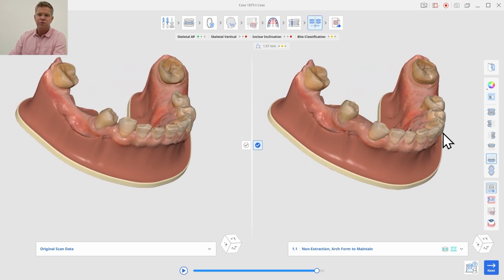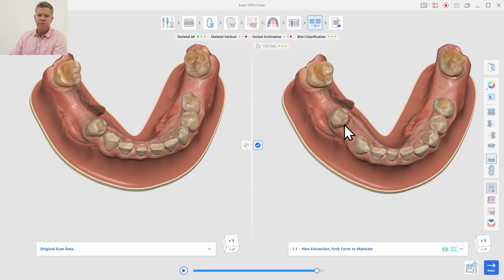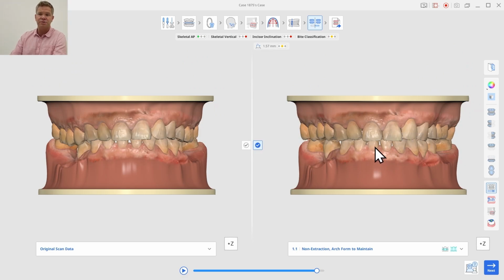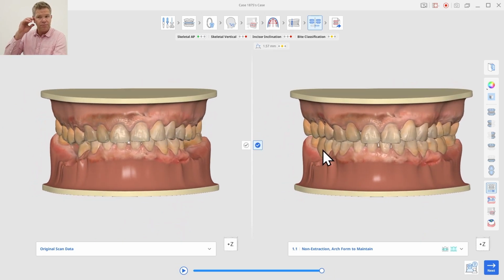So now with this tool, we were able to make a treatment decision of placing an implant in the 6 on both sides, as well as an implant in this 4-4 space, but doing the orthodontics first to set this up, and that really allowed us to be successful in this case in the future. This tool was used to explain this to the patient. The patient really liked this idea and was happy with the result, but all of a sudden mentioned, well, my front teeth still have a lot of wear on them. What else can you do?